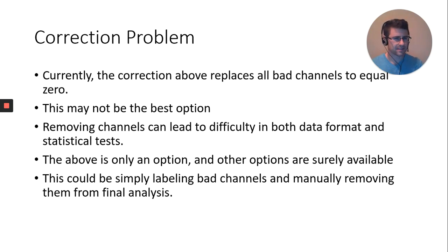It's a pretty simple script on how you can run this in the toolbox. There are several other ways to go about this, but this is a fairly easily understood and easy way to go about it as far as determining your data quality.